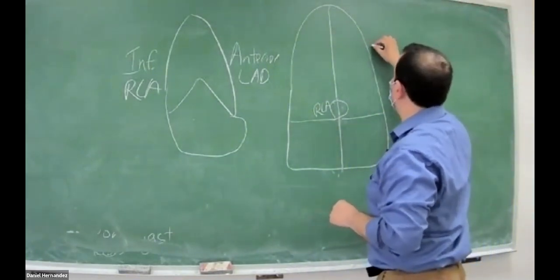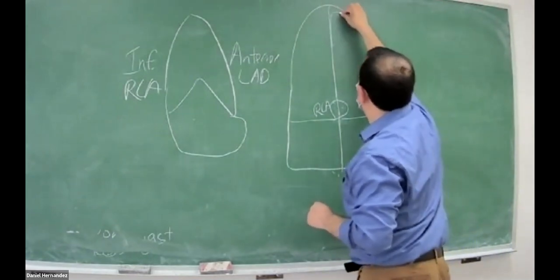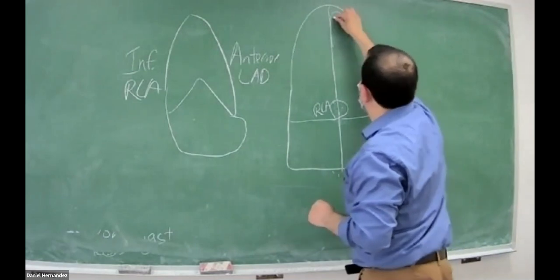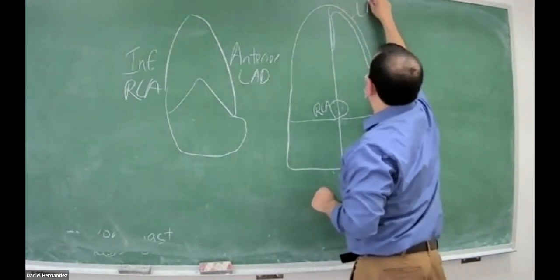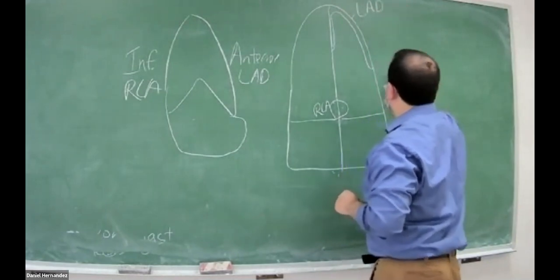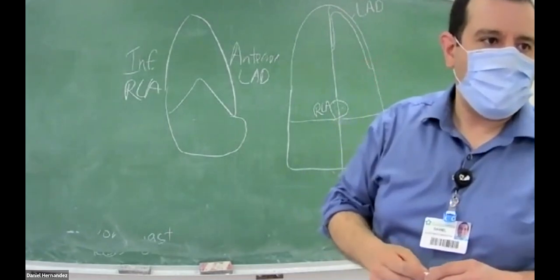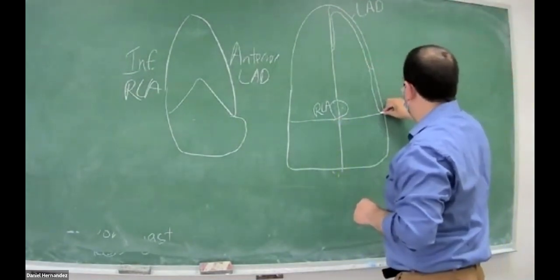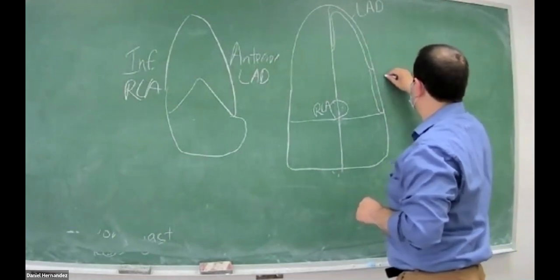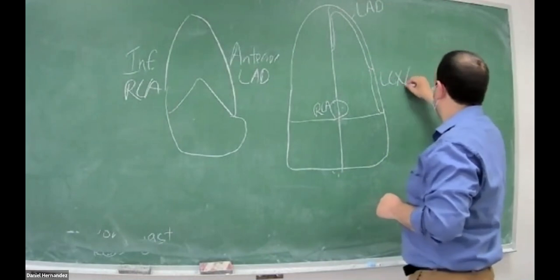So then for this segment, the apex is going to be our LAD. And then this segment is typically going to be left circumflex slash LAD.